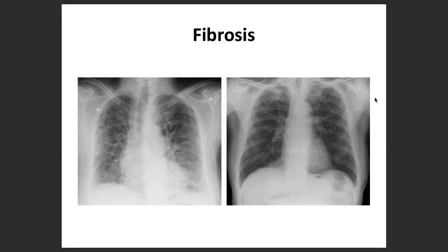So let's see what the possible etiologies are where it can happen. The possible etiologies are respiratory failure, pulmonary hypertension, or even heart failure as well. Right, sir. So what do you notice over here? Someone has already said about all these things. What do we notice? Cardiac shadow is also dilated, sir. Cardiac chamber, good, good.